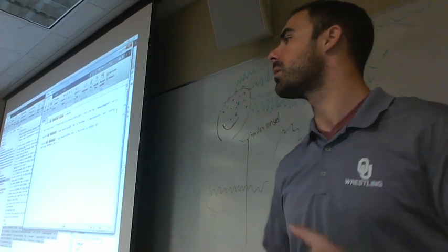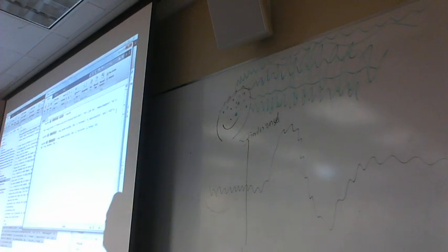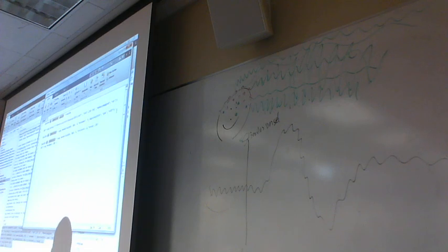Yes? So the purple part where it says C users, is that the directory? Yeah. And then biosig is the function that imported the file. Oh, okay. I was just wondering. Although I'll keep the EEGLAB on top.